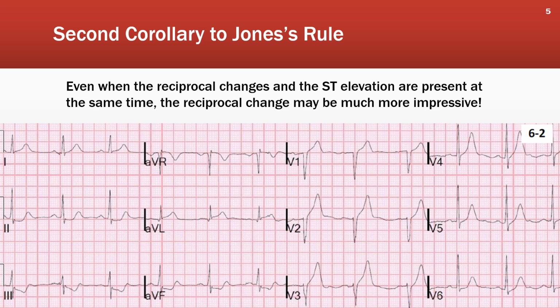If you look at just the limb leads, what do you notice first? You notice the ST depression. It's very obvious. But did you notice the ST elevation? So even when both are present, sometimes the reciprocal change can still be much more impressive.